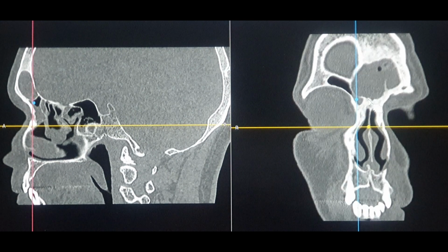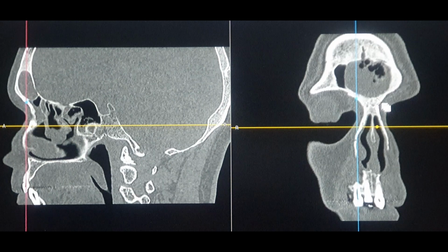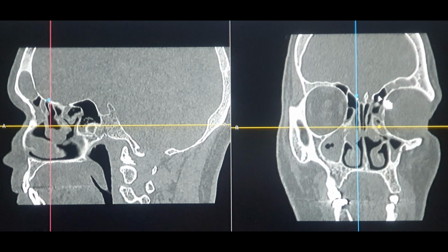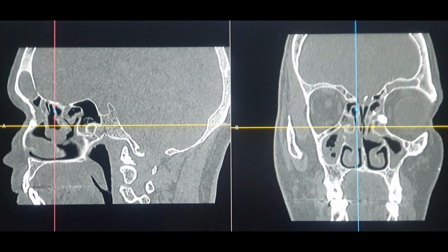So the only thing which remains is, because on the coronal section it suggests that it drains completely into the frontal recess on the left side, pushing the left frontal recess extremely laterally, and that is the indication of the sagittal and the coronal. And then if we keep on going posteriorly on the coronal section, we can see that this extension over here is actually the supraorbital cell. So this is not the frontal sinus, but the supraorbital cell.